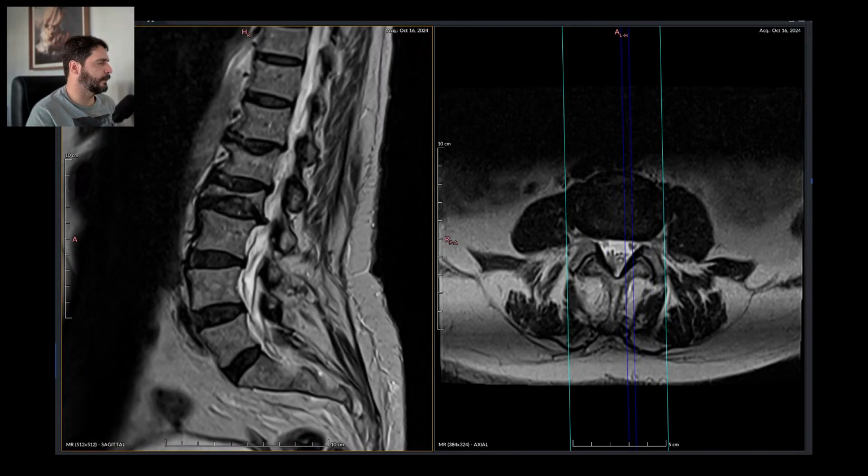And it's done. We are good to go. Was there contrast enhancement in this case? No contrast enhancement, fine. And this is most probably caused by severe osteoporosis.